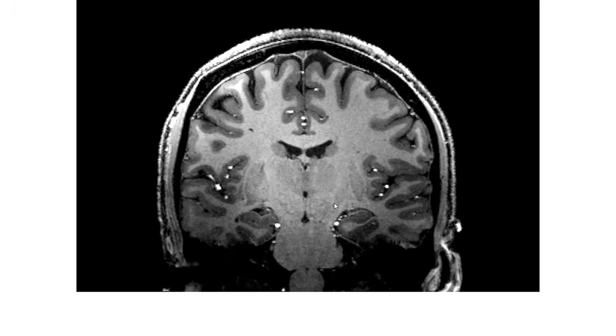We're much further caudal than we were before. Number 1, a midline structure sandwiching the third ventricle. Your choices of things sandwiching the third ventricle are either thalamus or hypothalamus. And this is a big heart-shaped structure, so that's thalamus. In the temporal lobe, you've got a 50-50 shot. It's either amygdala or hippocampus. This one is sort of smushy, swirly. We're much more caudal, so there's no way this is amygdala. This is hippocampus. And then this cortex here that forms an island inside the brain, number 3, is insula, or the island of cortex.